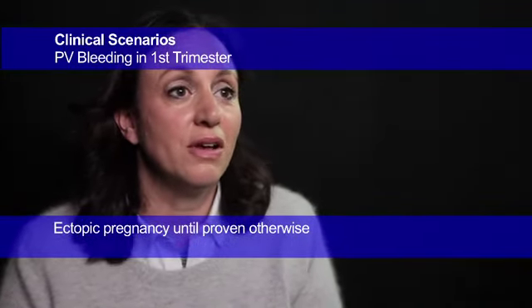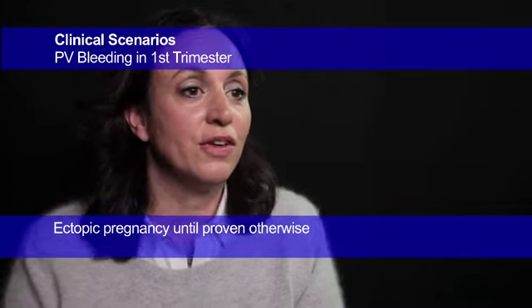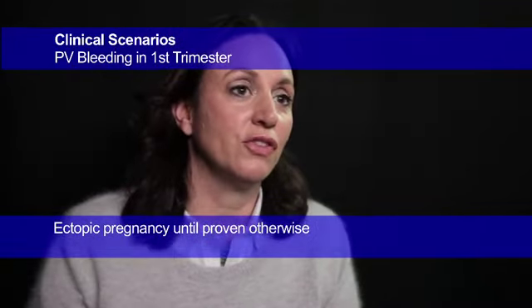This is determined largely by the potential adverse outcome with an undiagnosed ectopic pregnancy. Collapse of a patient, bleeding volumes into the abdomen is not desirable. Diagnosing an ectopic early enough to prevent this adverse outcome is obviously terribly important. So how do we go about this?